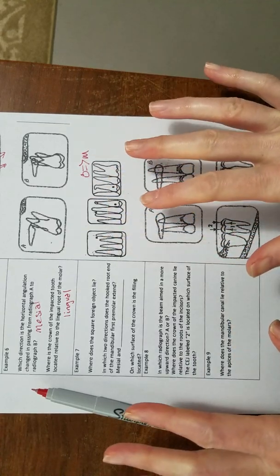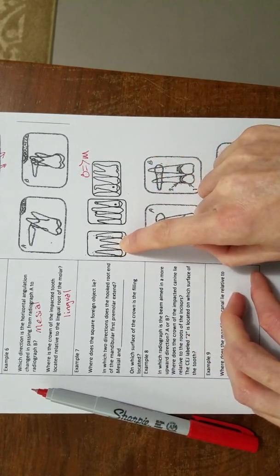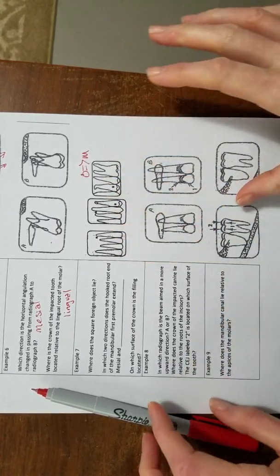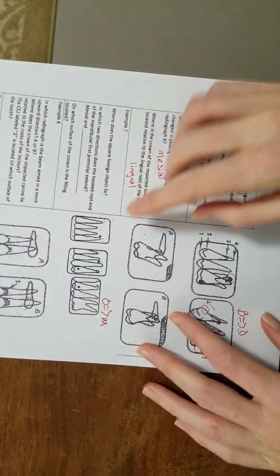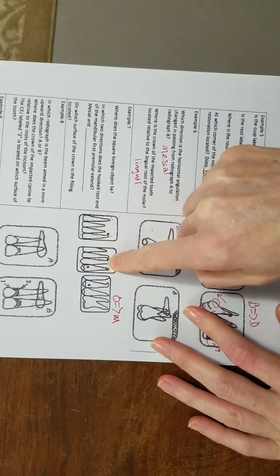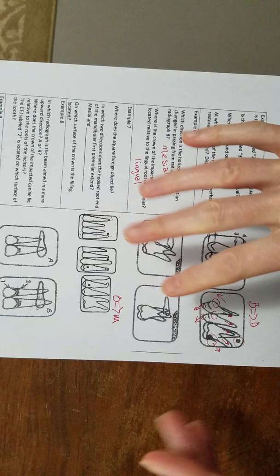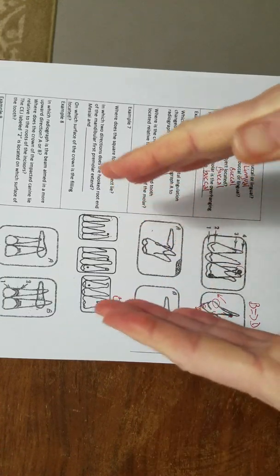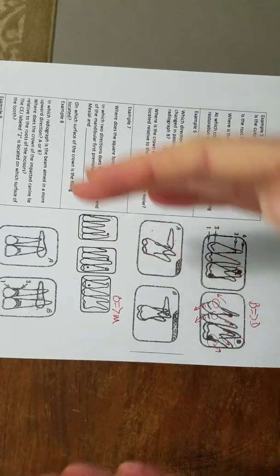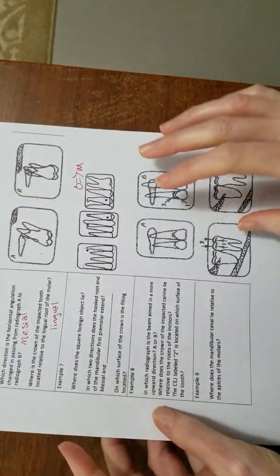You know why I think this is so confusing? This is just dawning on me. These are mandibular central incisors, and this is showing them like they're maxillary. Sorry to be really confusing, but I think it's actually supposed to look like this. These are mandibular central incisors, a canine shot on the mandible, and then a molar shot on the mandible. And I think that's what's adding to the confusion. But even still, central, canine, premolar, it's still going mesial. So it still applies, it's just weird to look at.